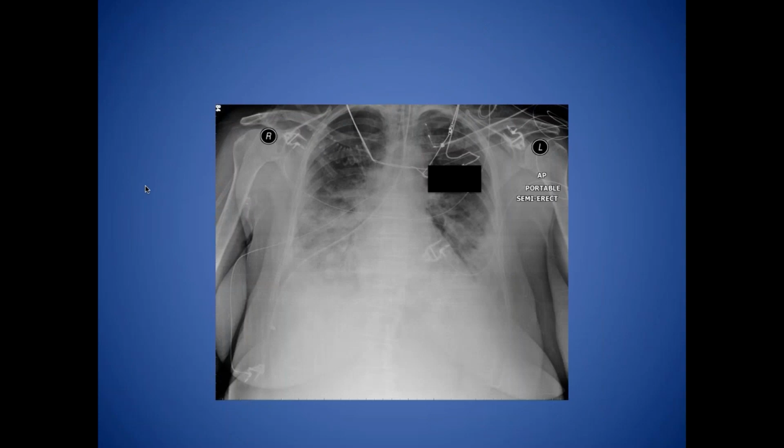There is another example where the patient has got a nasogastric tube which has intubated the right main bronchus, now into the right lower lobe bronchus, and it's gone so far down into the right costophrenic angle that it is likely to have caused visceral pleural damage.